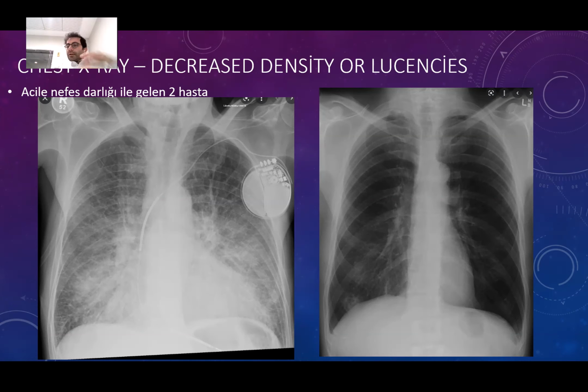So let's brainstorm a little bit. This patient is sitting at home. So there's a reason why it was sitting at home previous week. There's a reason why it is sitting here in front of you. So we are seeing some typical case of heart failure through that. But I'm just brainstorming. I don't know the definite cause for this patient. For example, there is an area of increased density, some sort of a consolidation on this area as well. So this patient might probably have some accompanying other disease as well.